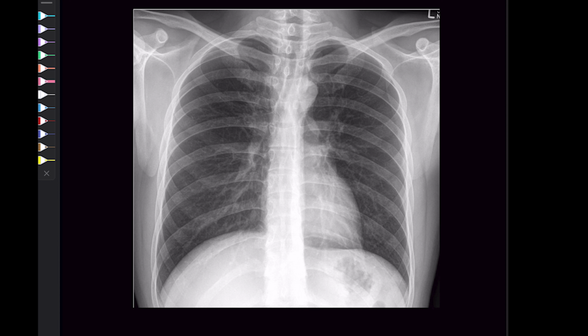We always follow the ABCDE approach. What is this ABCDE approach? We always start from the airways, then we look for the lung and pleura, that is breathing, and then C is for cardiomediastinal shadows. We should be looking in that for circulation, and then we should be looking for any kind of fracture to anticipate disabilities, and then anything else comes under E, for exposure. So this is how we can approach an X-ray chest.